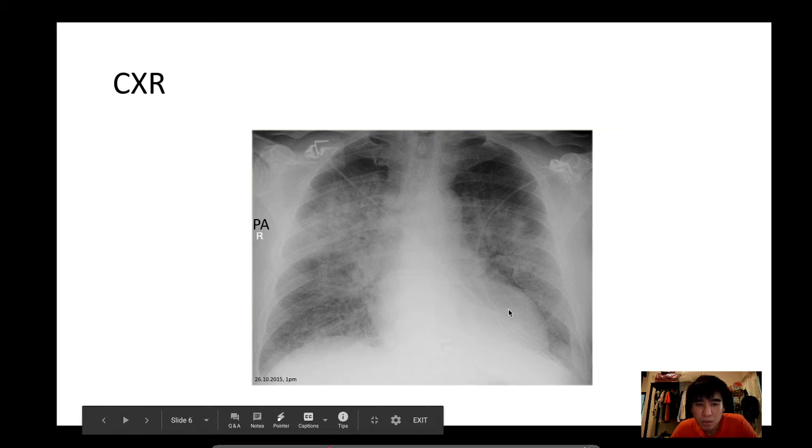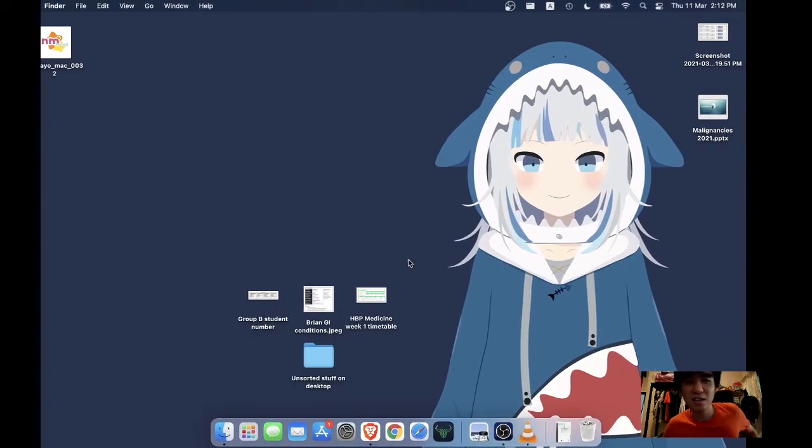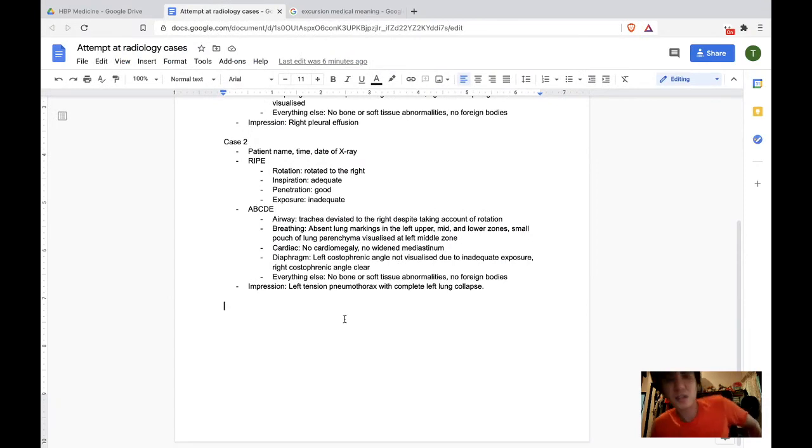I'll just write. Oh, the date and time is here. It's taken in 2015. This is outdated. This is the wrong X-ray. Okay, never mind. History. I'll just copy and paste again. I have enough time.